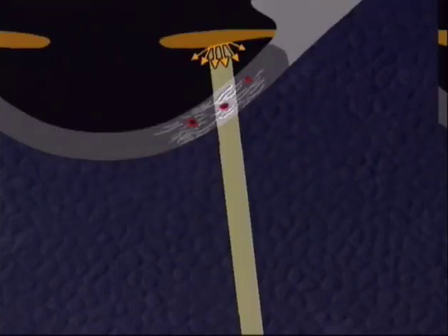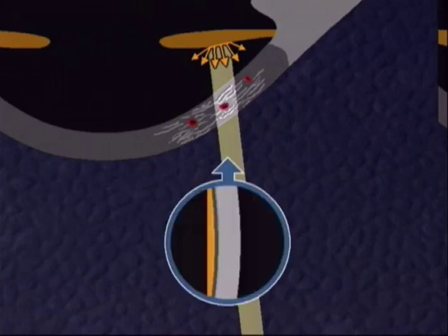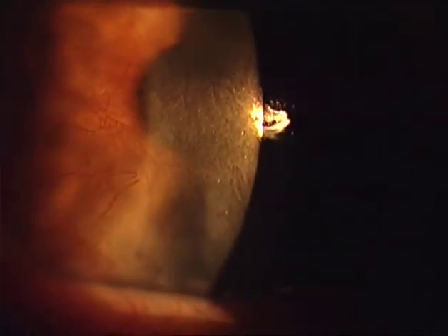This diagram shows a vascularized corneal scar with direct light and retroillumination from the iris in the same axis of observation. Seen through the eyepiece of a microscope, gray scatter and brown backlight overlap. Such an example of a vascularized corneal scar is shown here.